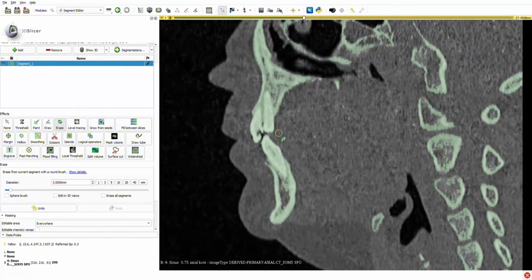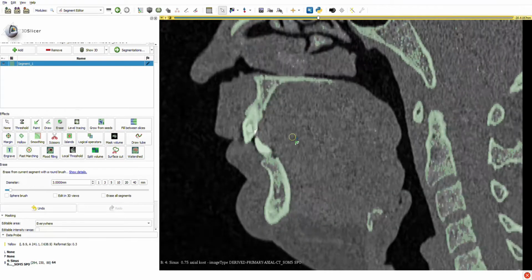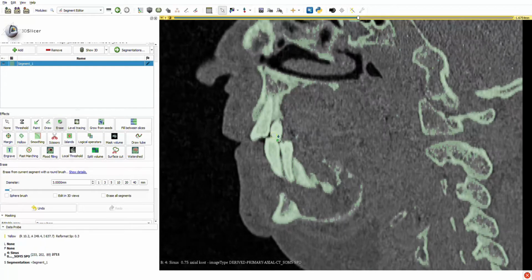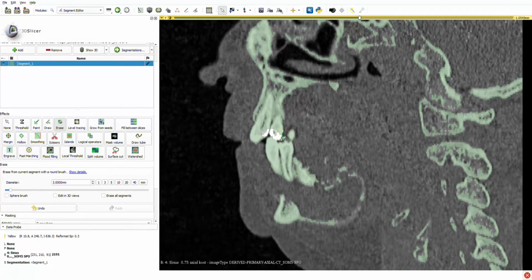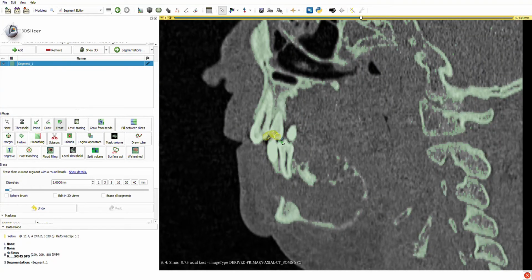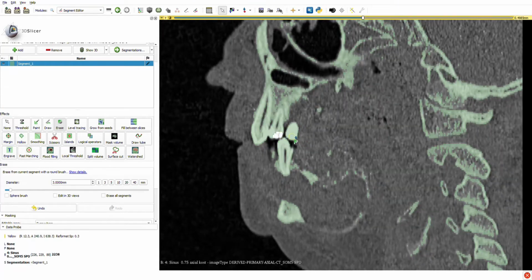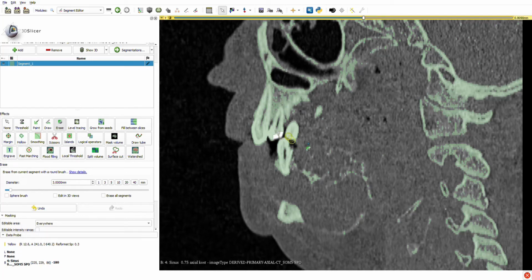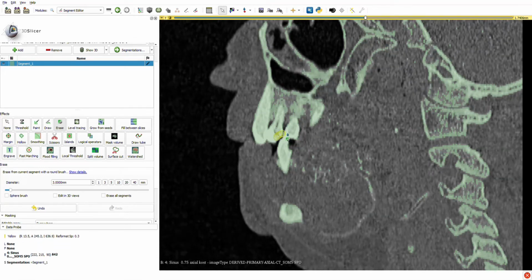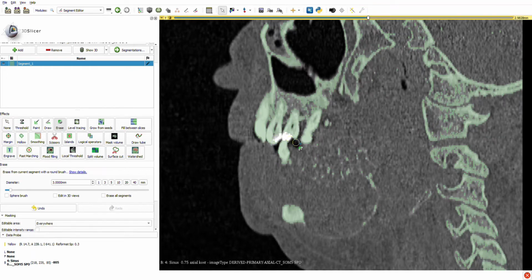This kind of segmentation is time consuming, but I have, as I said, better control. If you need help, there are some tutorials on YouTube. There is a website called Embody 3D, tutorials on how to segment your desired DICOM data. Also, if you have troubles, there is a 3D Slicer forum, so you can ask everything on that forum. The guys over there are really eager to help, and there shouldn't be any problem if you have any questions.